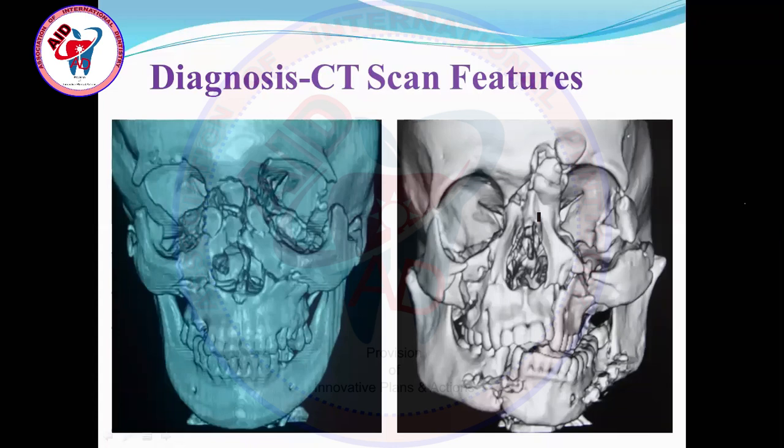And again, I will repeat, there are multiple mandibular fractures, midfacial fractures, as well as upper face fracture. Mandibular right parasymphysis fracture, left angle fracture, and bilateral lateral dislocation of both of the mandibular condyles. And there's Le Fort 1 fracture. Then there is a Le Fort 2 fracture also. And then bilateral zygomatic bone fractures, Le Fort 3 fracture, as well as lateral orbital rim fracture, orbital floor fracture, as well as nasoethmoidal fracture, and frontal bone fracture also. Then we can label this fracture as panfacial fracture.